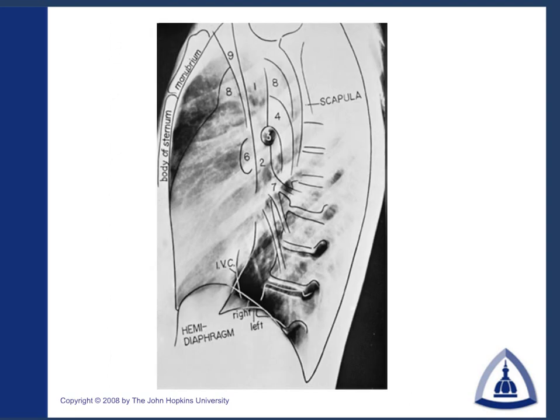Again, a normal X-ray with structures outlined. 1, again, trachea. 2, remember that's the right mainstem, much more vertical than the left mainstem. And this hole, this eye that looks right out at you at the lateral, is the takeoff to the left upper lobe. Okay, this is normal. Number 4 is the right pulmonary artery.